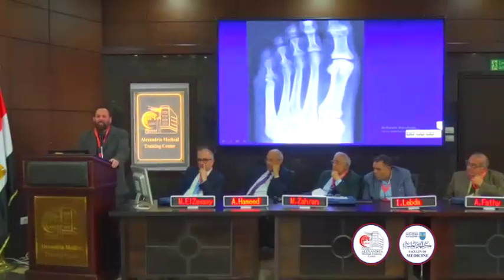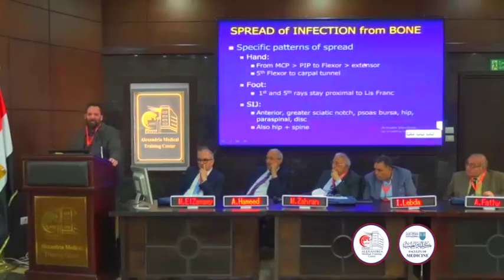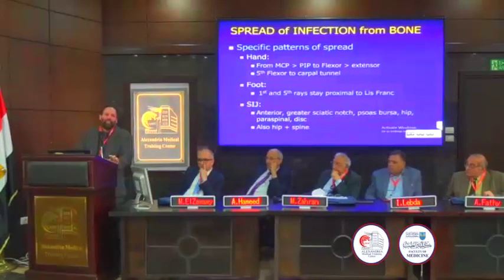And typically, the osteomyelitis leads to septic arthritis. Iatrogenic. Patient had an MCL reconstruction. The surgeon inoculated the bone. And we see multiple abscesses in the bone where the surgeon inoculated the bone. So that's how infections get to the musculoskeletal system.